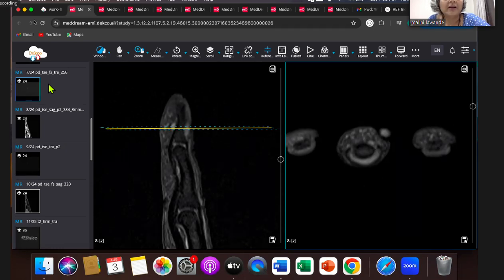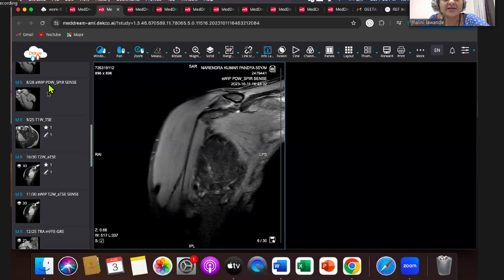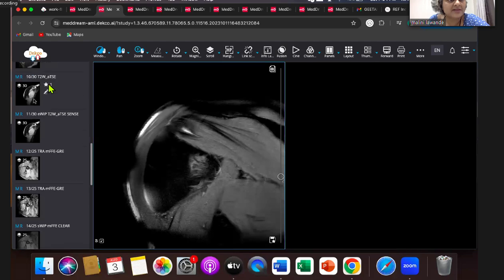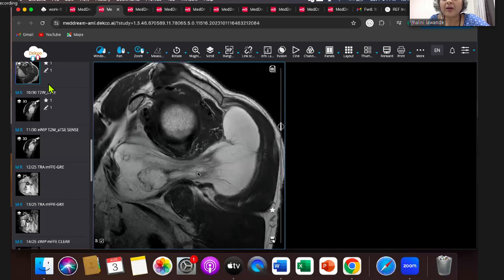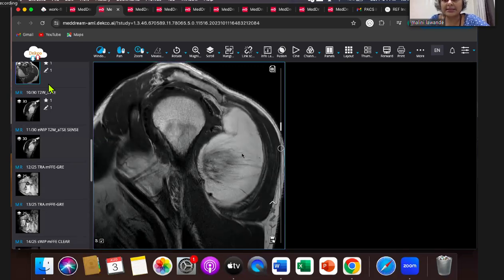Okay, so I think on time we have finished. Any questions as such? This was again an atypical lipomatous tumor. I just wanted to show you for that reason. And the reason is that especially the back tumors can have, because of trauma, some fat necrosis in areas like this.